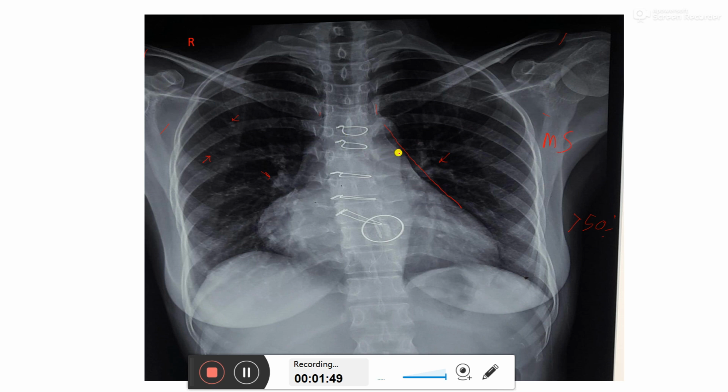In mitral stenosis, due to pulmonary overload, the left atrium remains here, and due to overload, left atrial enlargement occurs, and pulmonary hypertension develops. Due to pulmonary hypertension, the pulmonary trunk also enlarges, and so the left heart border becomes straight.